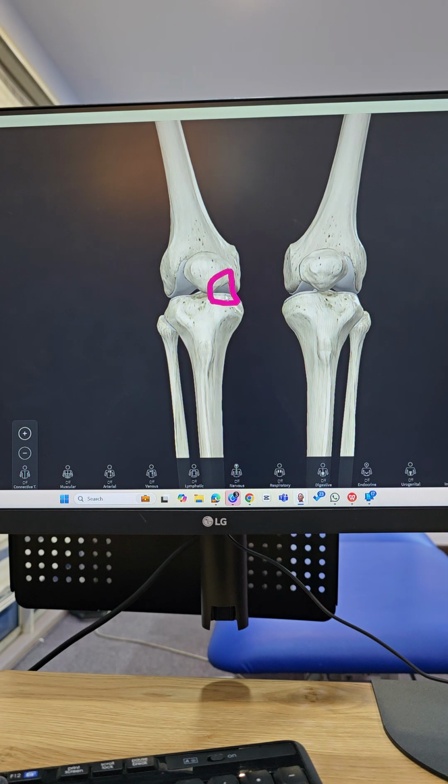So obviously we have your bone, osseous, around this bone edema area here. This area here, you have a layer 1 bone, you have your cartilage, soft cartilage, and also the patellofemoral joint surface on the under edge of it, usually triggered in the first 30 degrees of eccentric loading going down the staircase, right? And then you mentioned that you think it's at layer 2.